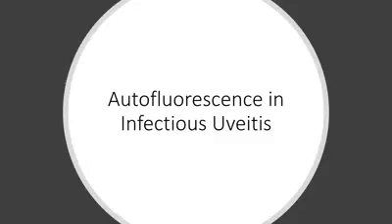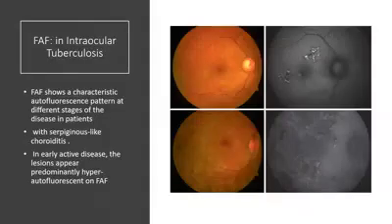The same thing for the case that I showed of TB, because we are facing many TB cases in the Middle East and also in some areas in different countries like India. Sometimes we need to take a decision whether we need to continue with the treatment or not, so I don't need to ask the patient to do any invasive test. Just with fundus autofluorescence, for example, if I want to look at whether this lesion is active or not, I can see there is hyperautofluorescence. So this is an active lesion.